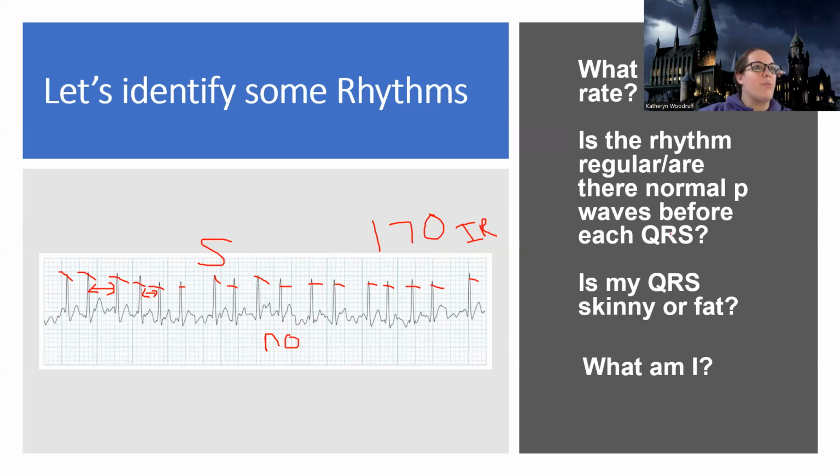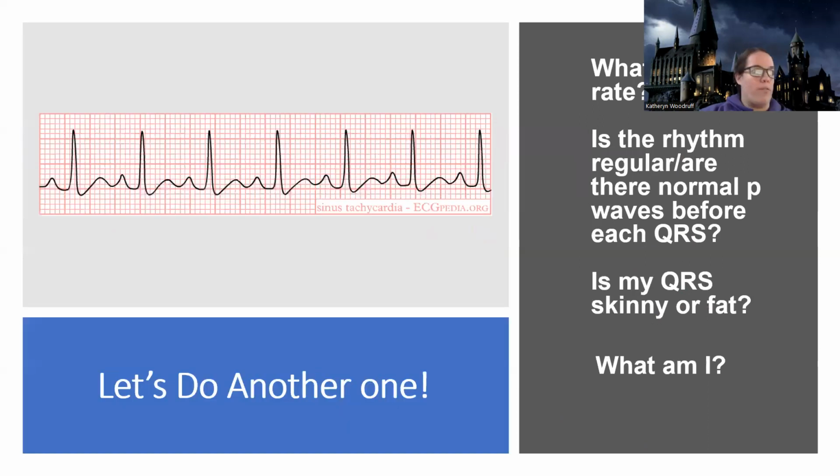You can see the reason that we're collecting all this information isn't because one part of it is going to tell me everything. But if I look at it as a whole, I can start narrowing down what it is. I think we have 4 of these. Let's do these together. All right, so now let's look at this one. Let's count.